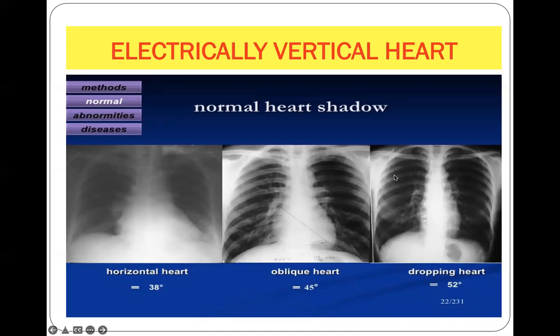Here, there is the presence of emphysema, pushing the heart towards the right side, away from the left side. Or the presence of dextrocardia, in which the cardiac apex is facing the right side.